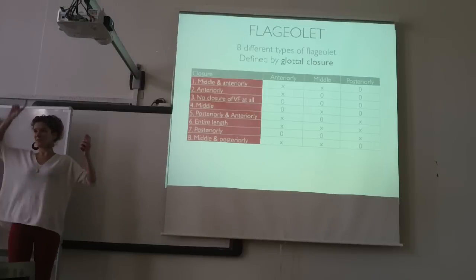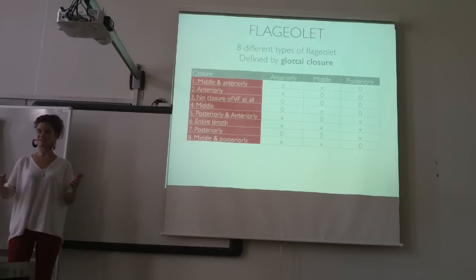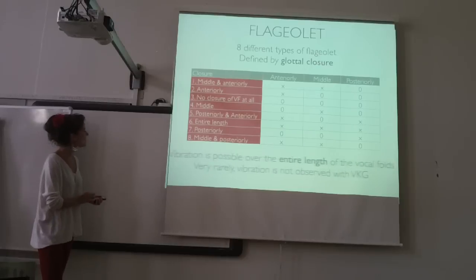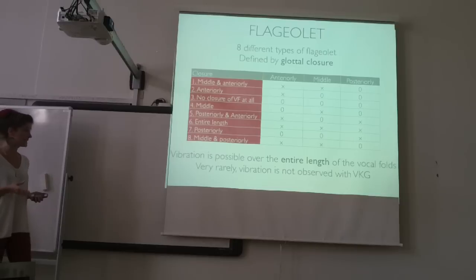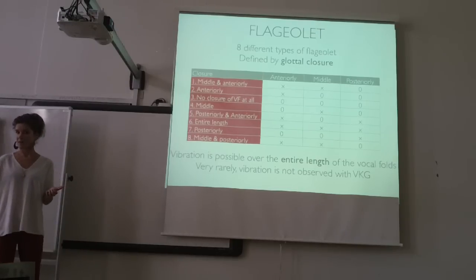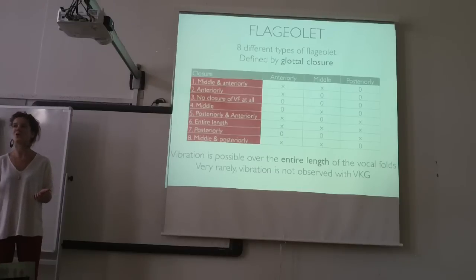So I'm putting question marks on flageolet. Maybe we should design a whole new mode on teaching how to sing flageolet. And we saw also a vibration over the entire length of the vocal folds. It was only very rarely that we didn't see vibration on the VKG image. Note how I say we didn't see vibration. I don't say there was no vibration.